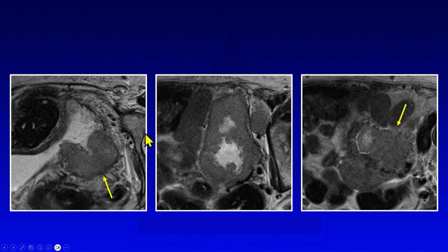And of course, we just wanted to get the MRI for a better look at the wall. And again, following the muscularis, we see clear interruption of the muscularis. And then also here is the uterus, and we can see that the mass is clearly abutting the uterus with loss of the fat plane between the uterus and the mass, and also it's abutting multiple small bowel loops.